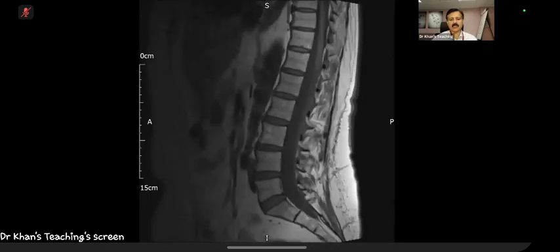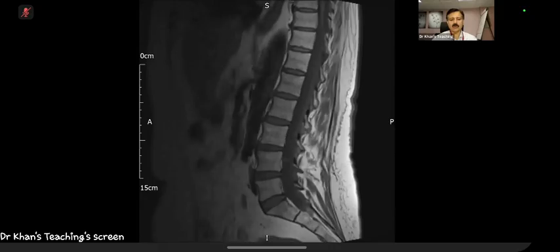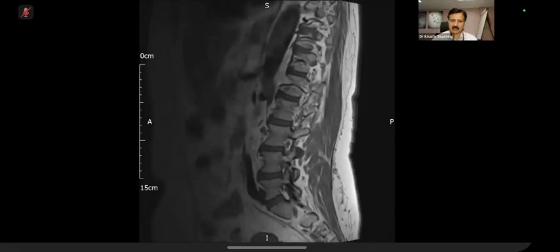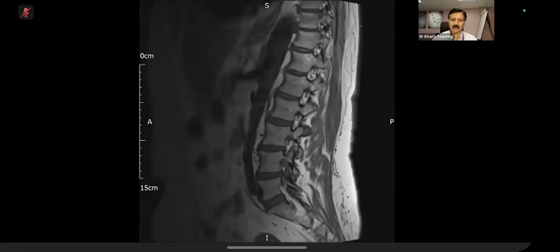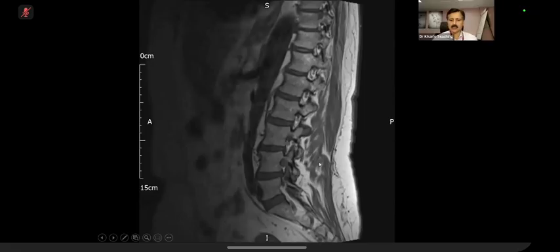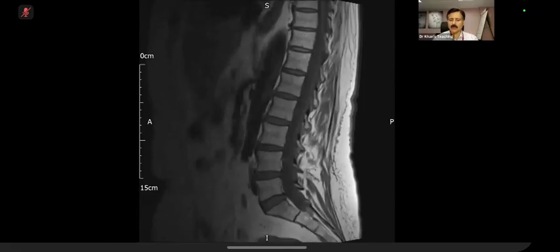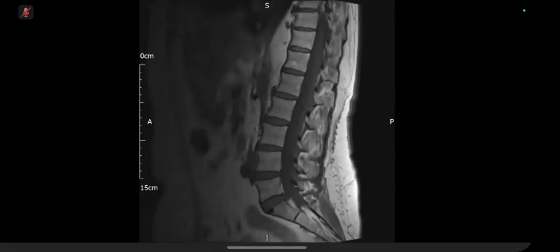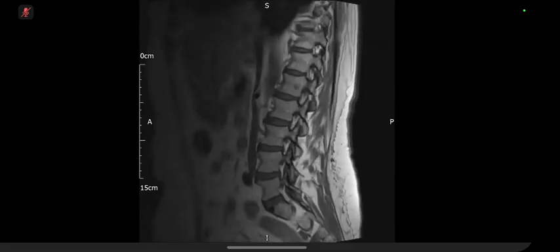This is a T1. Go back. You can see the fat, and there's normal tissue. You can see the epidural fat, and this is a normal sequence. Excellent. Next, please. What are you going to do? The Viva question will be. I'll inform the clinical team of the sequestered disc, and I'm also going to.